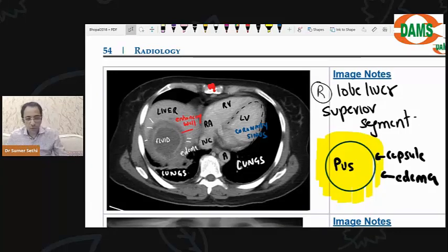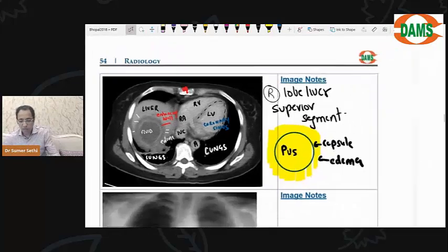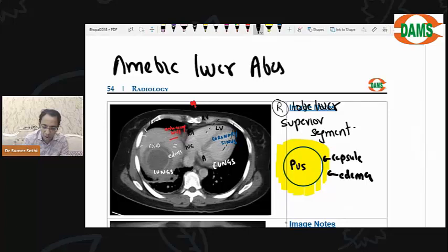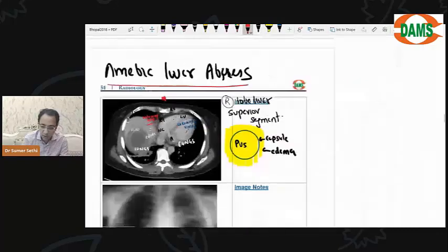Remember microbiology में बताया था उन्होंने कि when you are operating on hydatid, the hydatid should be removed in total. If you spill it, it will lead to immune response. Okay, so that is the key. This is how you identify that, because I am able to see a lot of evidence of inflammation around the liquid containing area, then I will call it an abscess.